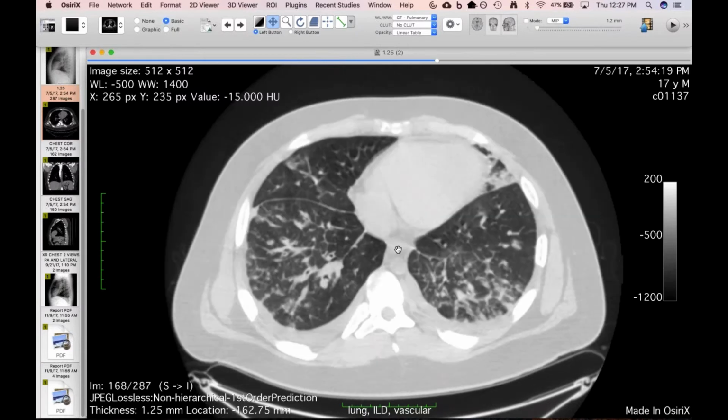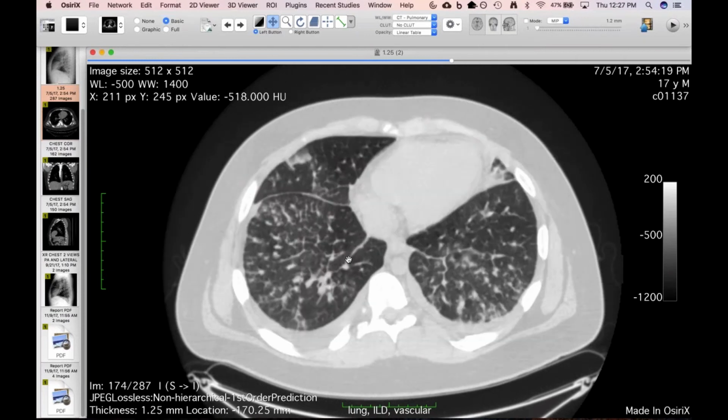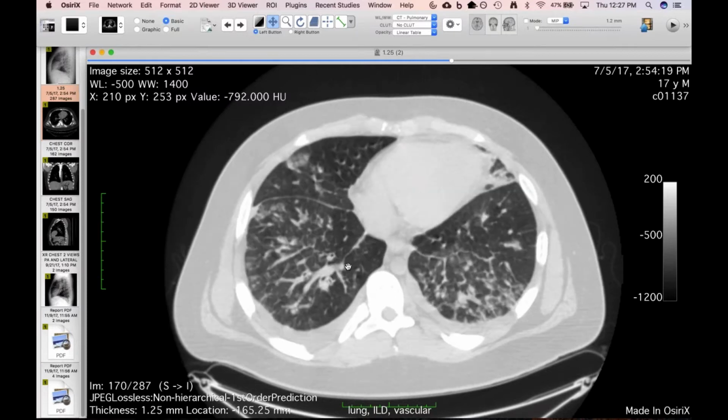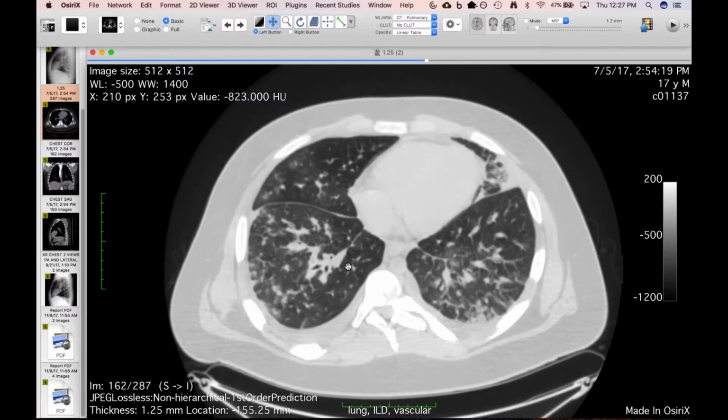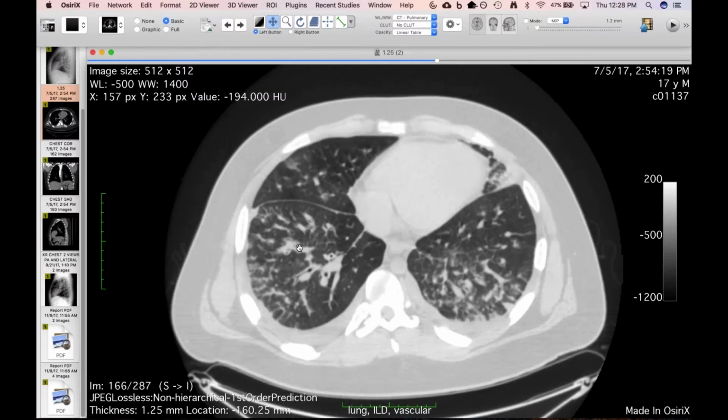There was just a case report of what we call excipient lung, but it was attributed to injection, I think, of heroin. So maybe the talc that was used to cut the heroin, in the New England Journal in the last few weeks. And it showed these very nice centrilobular nodules. Yeah, and that was actually a case from Emory. I think it was one of the ones that I diagnosed, and they didn't include any of us in that case report, but that's beside the point. This guy did not inject. There was no polarizable material. But it's really an interesting case, and path proven PVOD.